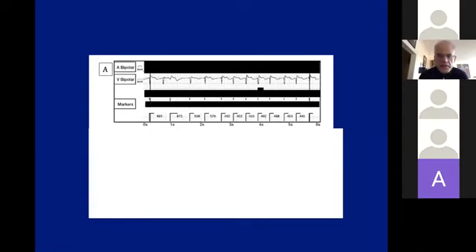Does the morphology change? Morphology looks similar. Is the onset sudden? It is sudden. Is it very fast? No. Is the V to V stable? No, it's actually unstable, right? It's a variable V to V. Do we see atrial signal on the V channel? I don't think so. Any suggestions what this may be? Is it SVT or VT?